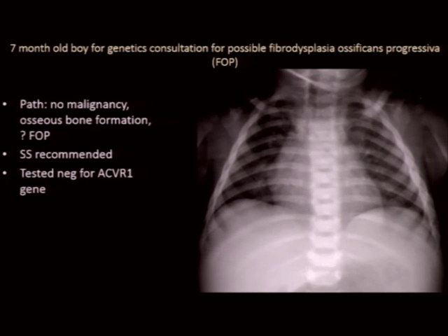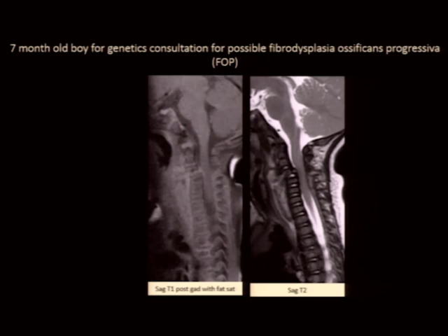If you go back and look at this imaging now with the benefit of hindsight, let's look at that spinal abnormality again. I think this looks very much like that other case that I just showed you with a fracture dislocation of the cervical spine. You can also see that the posterior elements of the spine are not properly aligned. Once you're thinking along the lines of trauma, then it becomes obvious that the prevertebral mass is really a hematoma that's starting to organize and calcify, hence the pathology of myositis ossificans.